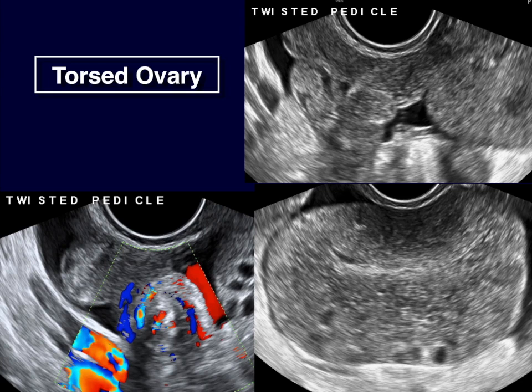This is a torsed ovary, and you can see how enlarged and edematous this ovary is. It really looks like a rather homogeneous type of enlargement. It doesn't look like there's a particular mass somewhere. And there are also small follicles in the periphery here. Now, this patient obviously came in with a lot of pain. You can see the pedicle seems to be rather swollen as well.